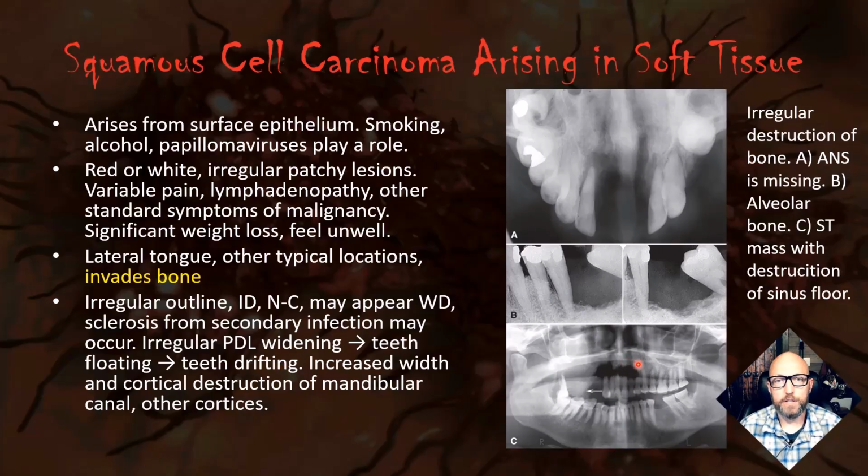Okay, what is the big worrisome thing in the panoramic radiograph here? Look for the anatomical structures. Hopefully you've watched my lecture on interpreting panoramic radiographs and you recognize all these different anatomical structures, especially the sinus floor and the zygomatic process of the maxilla. And you notice that one of those is missing here. There's no sinus floor. The maxillary bone over here is completely missing. You don't really see where it starts or stops. We've got this tooth floating in air here.